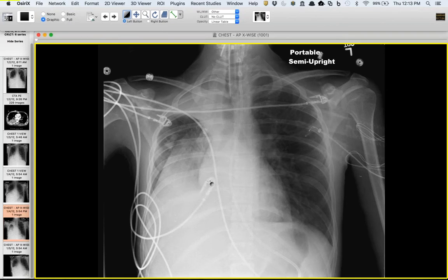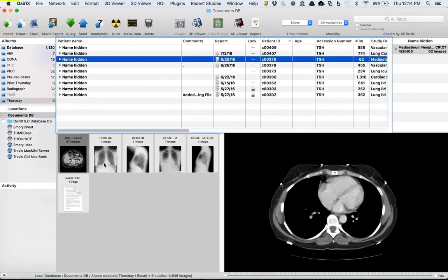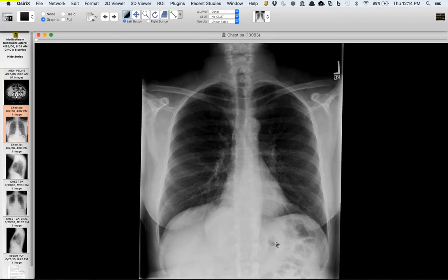Yeah. And right upper and right middle can more simulate left upper lobe collapse, correct? Now you don't have the aorta to give you the true Luftsichel sign, but I think I remember reading that one time. But I'd never heard the term elephant's ear. I'll look that up. I think if I remember correctly, Carl Furman from Pittsburgh had one of the ACR case in points probably several years ago now that was right upper and right middle lobe collapse that I distinctly remember, which I thought was cool, just seeing these different combinations. Yeah, I want to look that one up because I stand to be corrected, but I think the elephant's ear sign is the right upper and right middle combination.